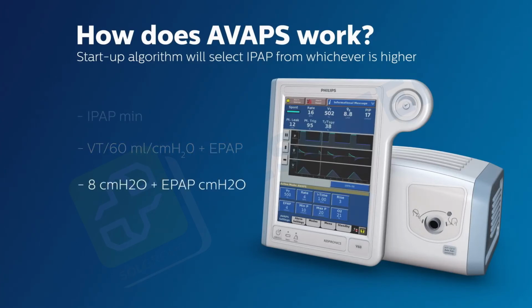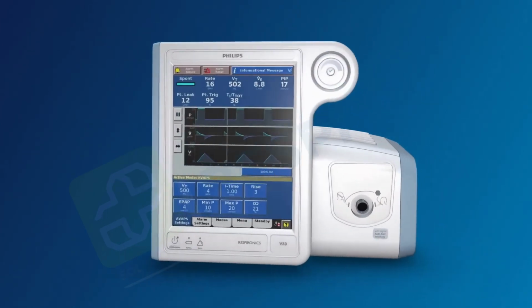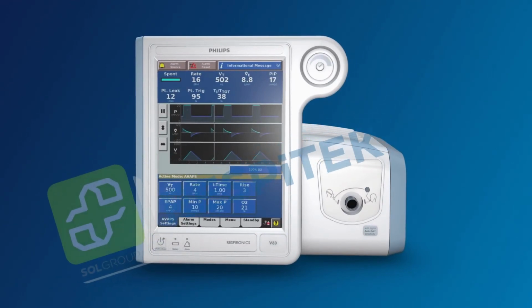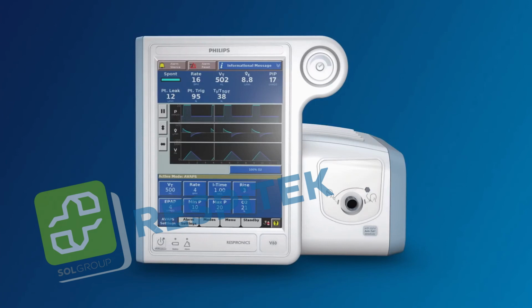Or maybe this calculation here produces the highest value, and therefore it will be the initial IPAP setting. The good news is that you do not have to calculate and determine the higher value. AVAPS automatically selects the highest one of the three and institutes that IPAP as the initial IPAP setting. Now that's really intelligent. Now you should have a better understanding of how AVAPS works and how you can use it to adjust to your patient's needs.